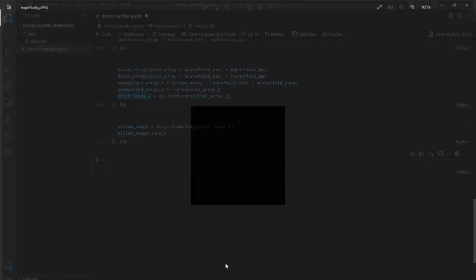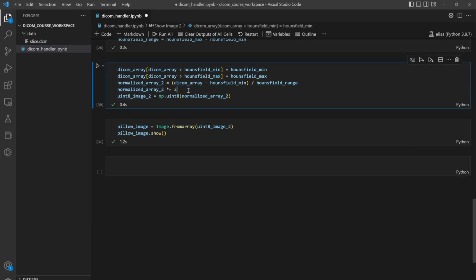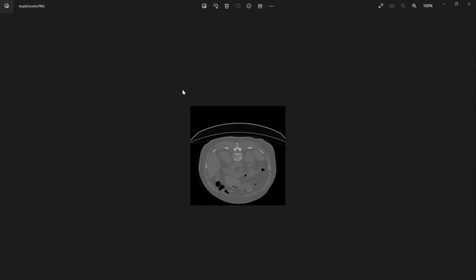Okay, now if I show the image, there is something that I didn't expect. Let me just see, where is the problem here? Sorry, I should multiply it by 255. I multiplied it by the same image, which is not correct, so I should multiply it by 255 so that I get values between 0 and 255. So let me rerun the cell again and show it here.